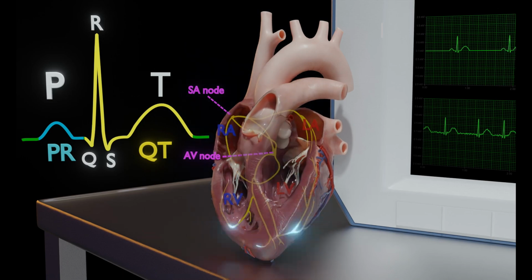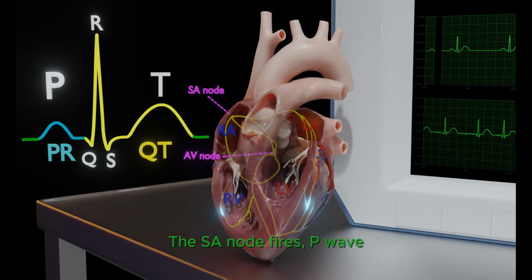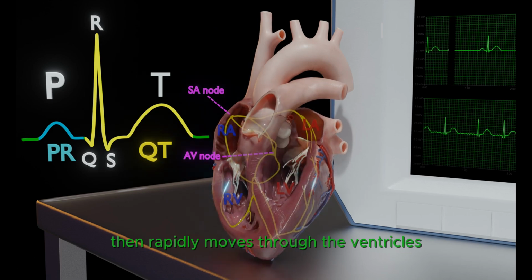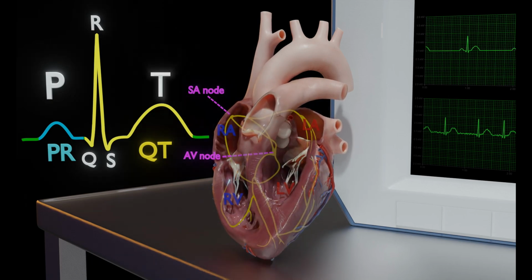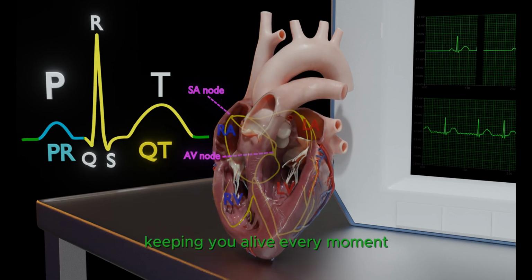So, let's recap. The SA node fires, P wave. The signal pauses at the AV node, PR interval. Then rapidly moves through the ventricles, causing contraction, QRS complex. And finally, the ventricles reset for the next beat, T wave. This perfectly timed cycle repeats again and again, keeping you alive every moment.